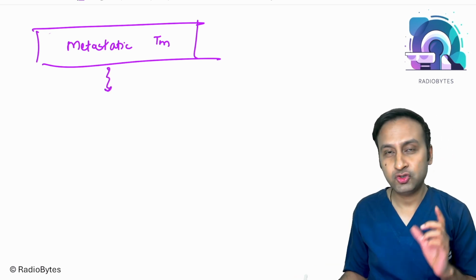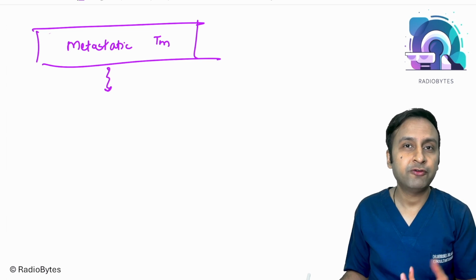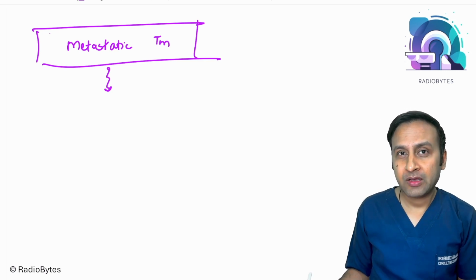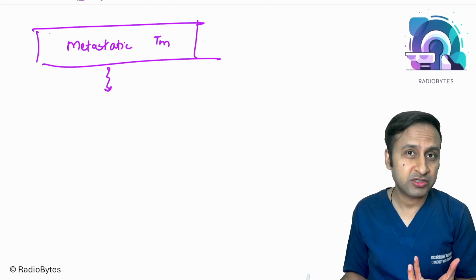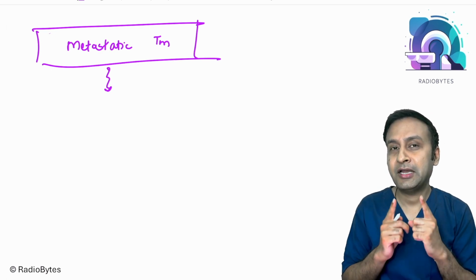Now it's a metastatic tumor, and a metastatic tumor in a young male which is presenting in the form of significant retroperitoneal lymphadenopathy, retrocrural lymphadenopathy, ascites, pleural effusion, plus a deposit in the pelvis. What do you think would be the possible primary? Now, to understand the possible primary, we went back to the CT again. We tried to dig out, search something, and there was something in the CT that we were missing till now.